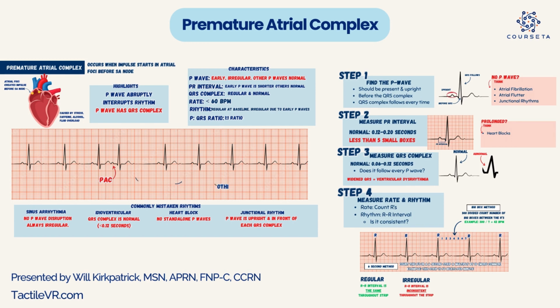Now you'll typically see a longer P to P interval afterwards because the heart's kind of just trying to reset its rhythm. So the heart, once again, has a regular rhythm underneath. It just spontaneously has a premature atrial complex. So it's not abnormal to see a prolonged little pause here right after a PAC.